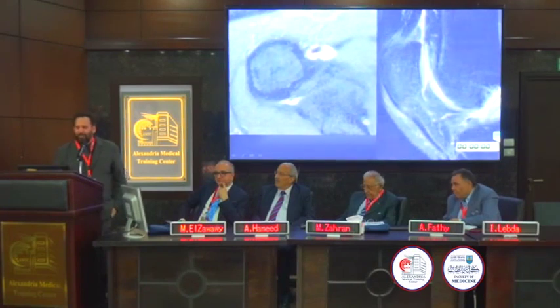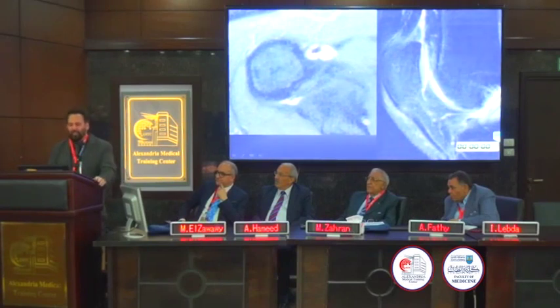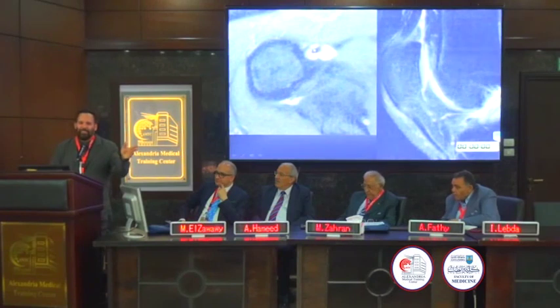So here's a biceps tendon, T2 weighted MRI. Here's the tendon, here's the synovial sheath. You see these black spikes coming out from it? Can you see those? If you look at every MRI of the shoulder, you will see it. And those are called vinculae, and the big one is the greater vinculae, and this little one is the lesser vinculae, right? Not a trick question.